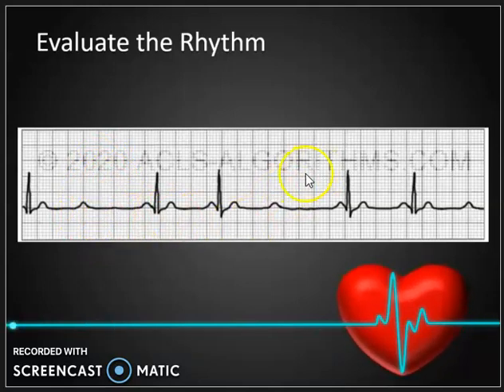So it's just dropping a QRS. It would be regular otherwise. It didn't drop that QRS. We've got a normal T wave here. No ectopic beats. This is a second degree AV block, type 2. Okay, so a type 2 second degree AV block.